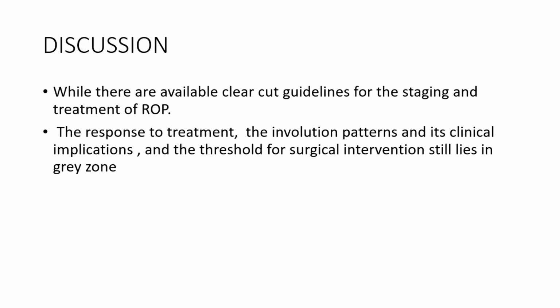In this case, you would wonder why we haven't given anti-VEGF injections. That will be the first thing that you will think, right? But you just saw that. That's just the same laser dye. I've just done the photograph after the laser. So we still have to give a chance for the laser to have an effect. There is really no TRD. That's why we did the ultrasound. There's no TRD. So we're just waiting for the laser to have an effect, and it will regress.